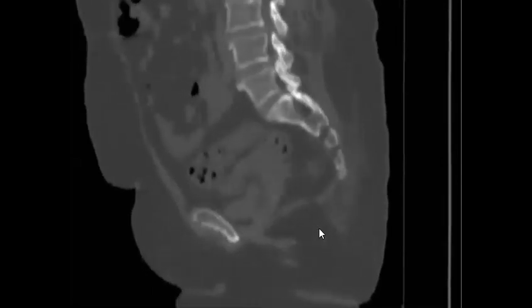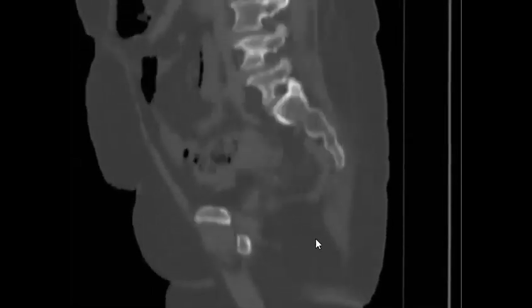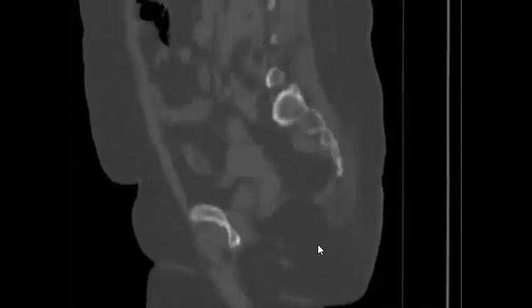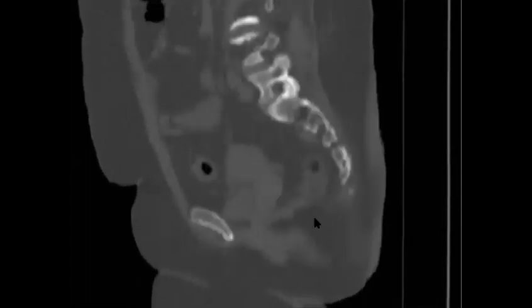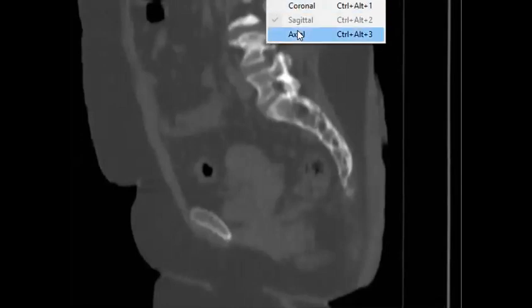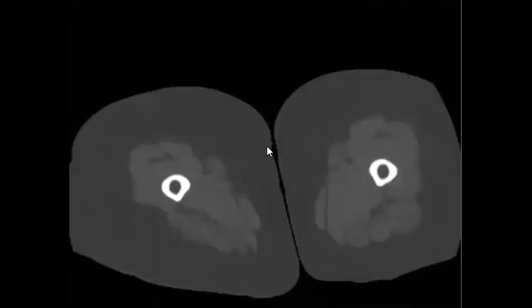Where is the omental lesion? Where is it? Okay, in axial, perfect. Let's go to the axial.